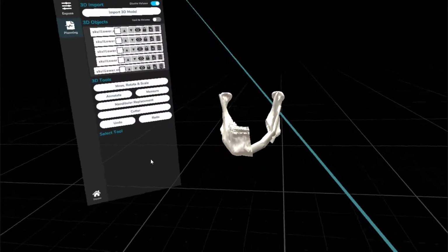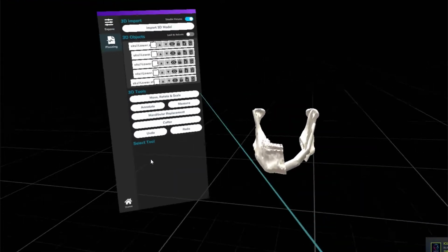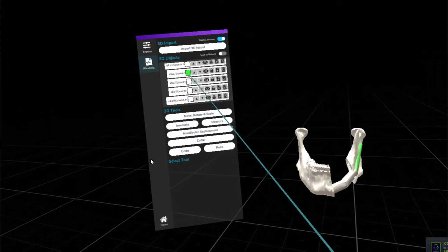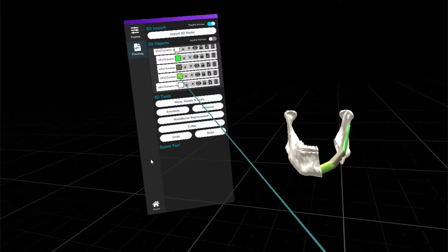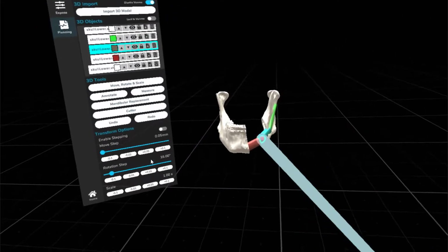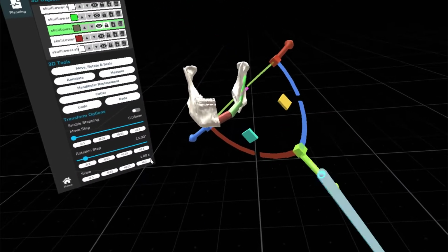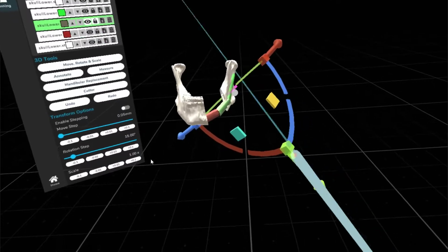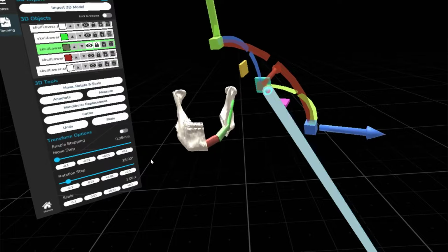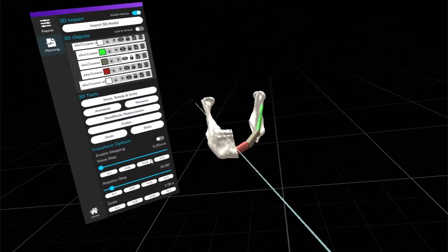Now, the other thing we can do with this, as you've seen, it's automatically hidden the bit of geometry that you selected to replace. And what we can also do is we can actually set these colors up individually for these replacements, and they're treated as normal objects inside the scene. So we can actually go ahead and say, oh, this one, you're not happy with it, you can maybe go ahead and move it and rotate it. As before, you can hit the middle mouse button and basically reset all the coordinates for it, and you can manipulate the pivot for them, or we can just go ahead and put it back as we want to.